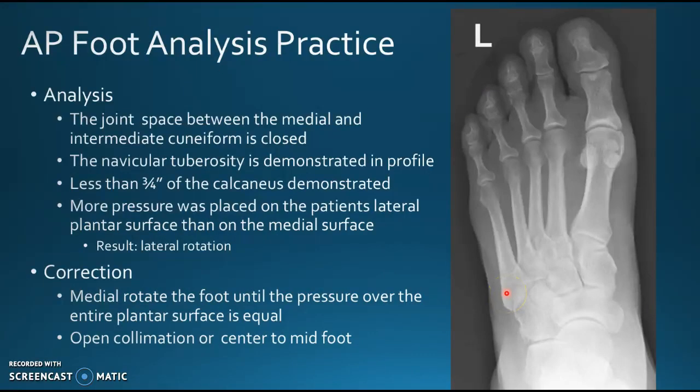All right, looking at this image, an AP axial foot, the joint space between the medial and the intermediate cuneiform is closed. So that is over here.